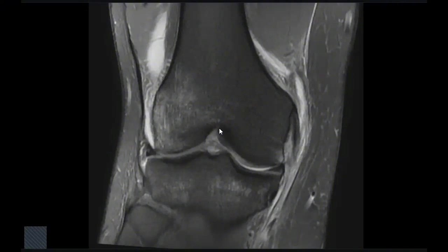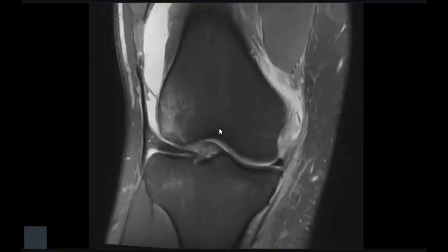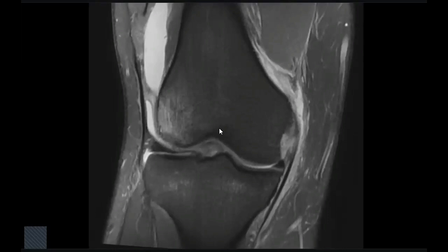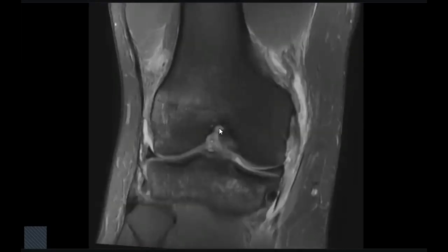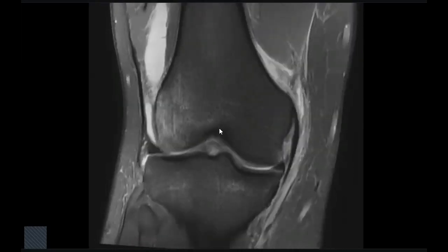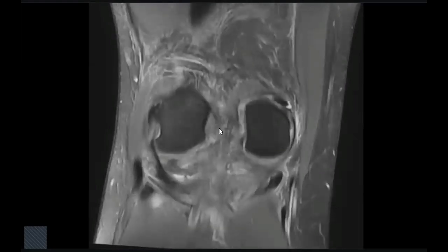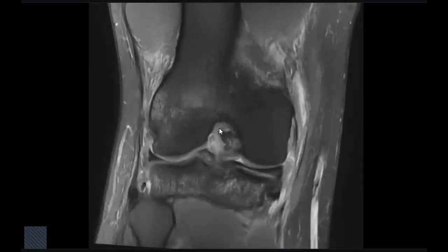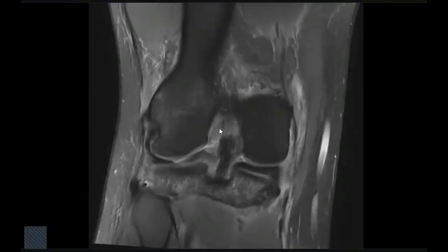What about the medial collateral ligament and the lateral collateral ligament? Yes, sorry, I forgot. Here is the medial collateral ligament. It appears intact with high signal intensity surrounding it, which might be due to sprain. The lateral collateral ligament also appears intact. The fibers are intact with high intrasubstance signal, might be due to sprain.